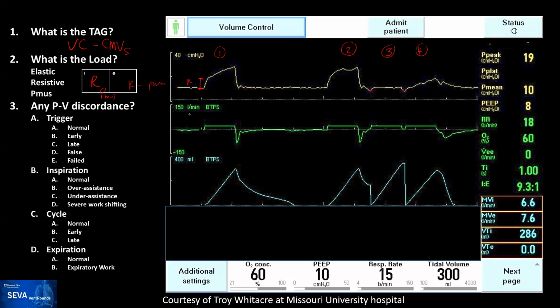Yeah, that's all good. Right. Okay. So if anything, what I would ask is, whenever you're seeing these waveforms, one thing to increase your ability to look at the expiratory waveform is just adjust the gain so that you're able to see this with better definition. That will help you, definitely.